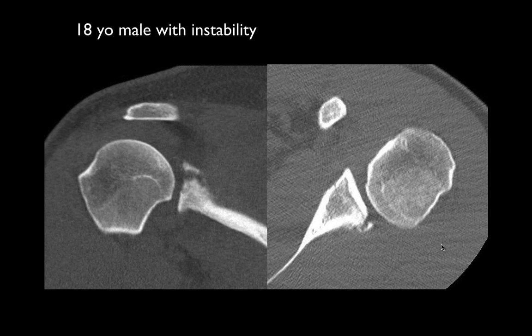I think that this is a posterior dislocation with a fracture of the glenoid rim. But this calcification is probably not from that. If we go back and look at the MR examination, this corresponds to the black line that we saw for the displaced labrum and the periosteal attachment.